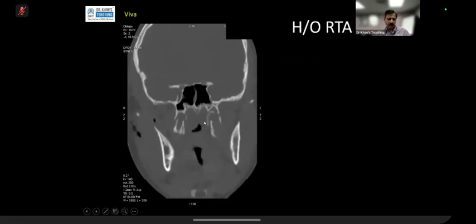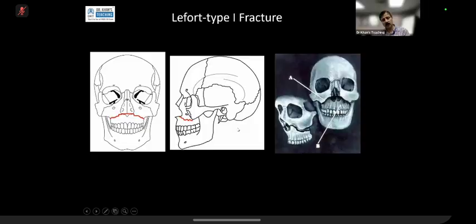Can you describe this? Yeah, there are multiple fractures involving the bilateral medial and lateral pterygoid plates, and there is also a mildly displaced and a linear non-displaced fracture of the right frontal bone. So this is likely one of the subtypes of Lefort fracture. In my routine practice, I would like to review the rest of the images to further characterize the type. Excellent, well done.